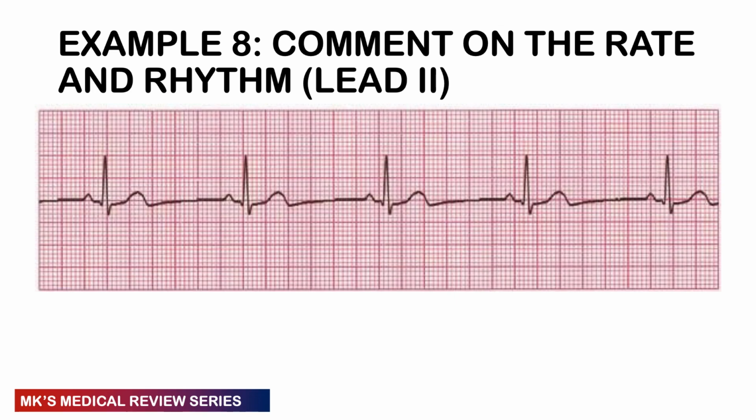Now what about this other one here? Comment on the rate and the rhythm. This was also gotten from lead 2. You may pause the video again. Okay, and here comes the answer.